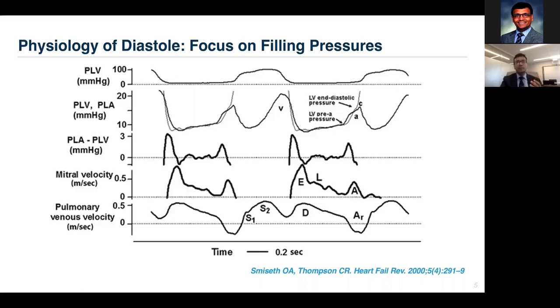During the diastasis, the pressure gradient again equilibrates, and as a consequence, the flow across the mitral valve is reduced. And this is the diastasis phase where typically you do not see much flow velocity. Infrequently, this flow velocity could be higher if the pressures are still not completely equilibrated. And this can give rise to the genesis of an L wave. And this L wave signifies elevated mean left atrial pressure, even in the phase of diastasis.